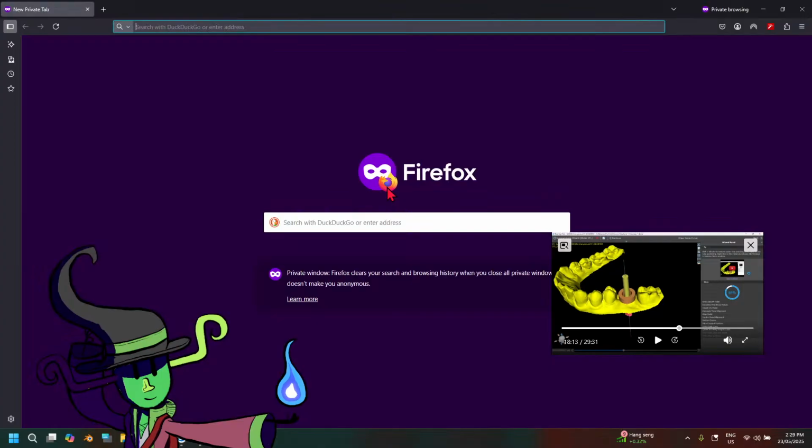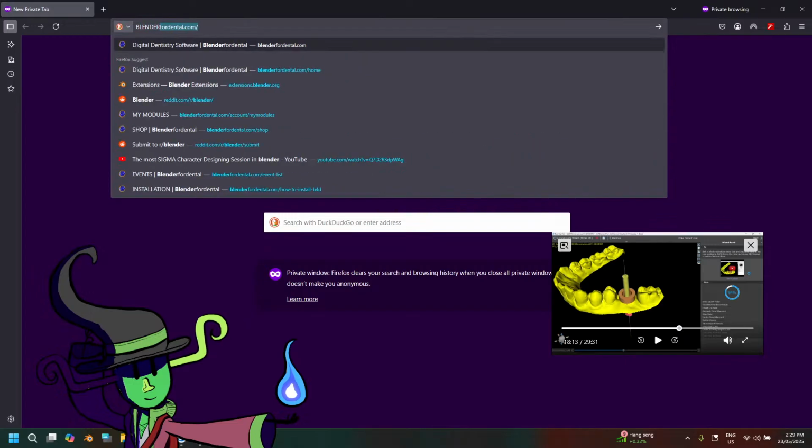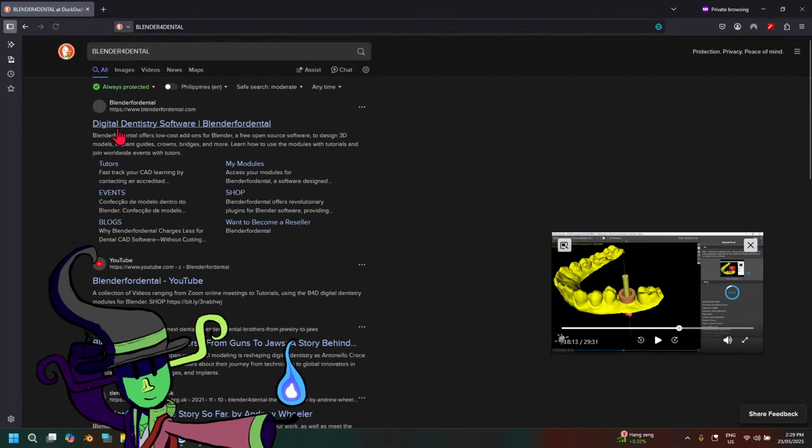Incognito, please. Let me see. Blender for Dental. There we go. I have caps lock enabled for some reason. Okay.